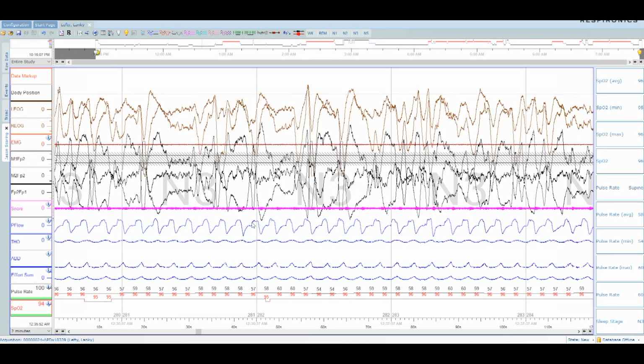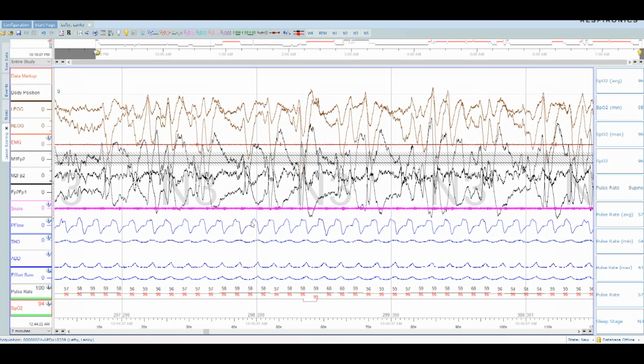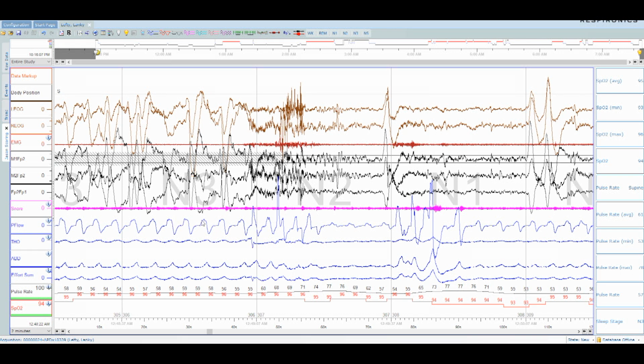Here we go. I can feel my muscles growing as I watch this. Look at those delta waves. Good Lord, Jason. Or I'm sorry, good Lord, Jawson. Look at this. We have an arousal.